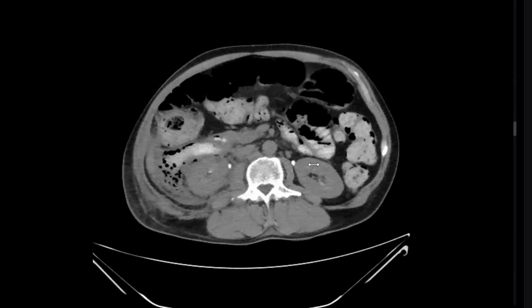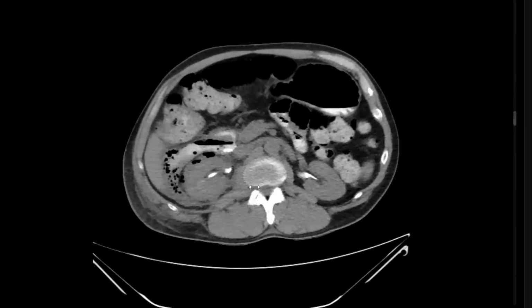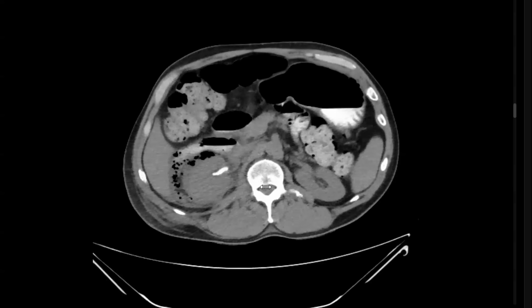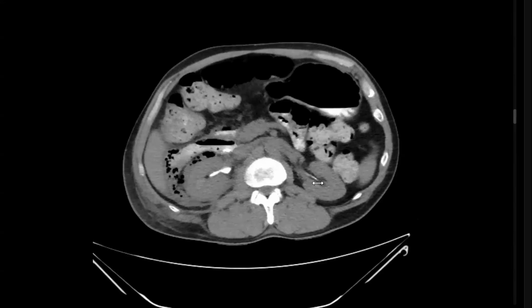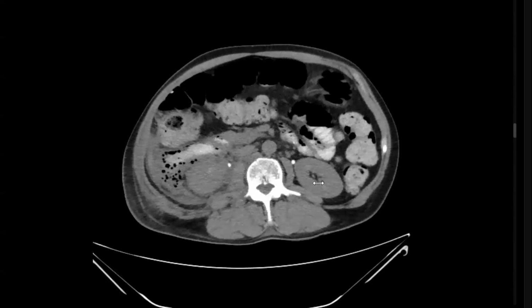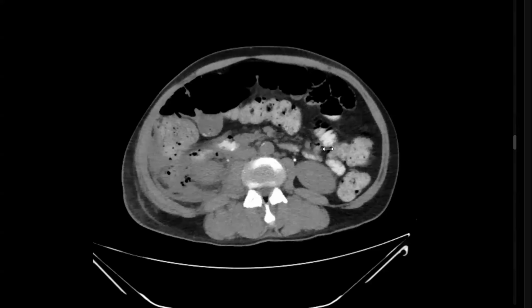Okay. Thank you. I can see there is contrast leak from the second part of the duodenum to the area of interest. So it is a duodenal rupture. Show me the site of rupture or ulceration. Here is the same place. The hyperdense focus may represent a food particle extravasated or extraluminal through this defect. It is a surgical emergency. I will urgently refer the patient to the gastroenterology surgical team for fixation of the duodenal perforation.